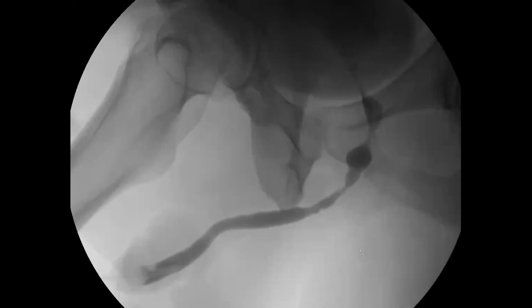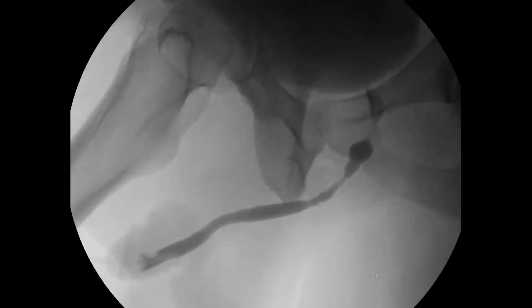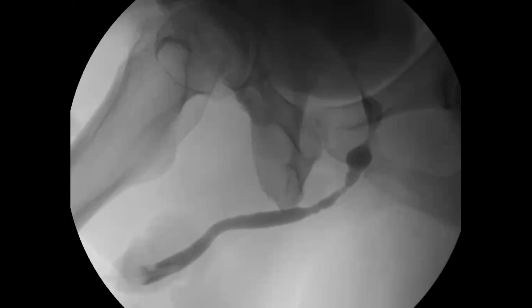So this was a RUG. I've actually done a few of these recently, and I'm just curious, what do you guys think about this RUG? Stricture and irregular, a little bit of beaded appearance, any kind of your STDs. Yes, exactly. So this is gonococcal urethritis. This was gonococcal STD causing multifocal strictures here.